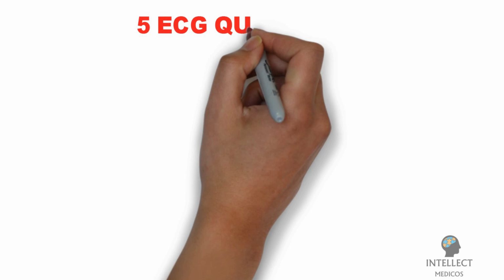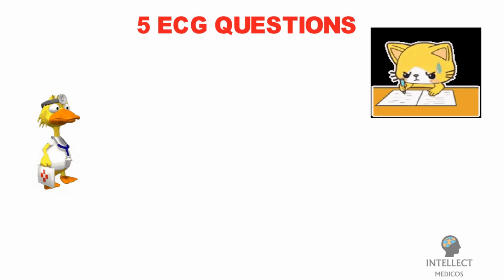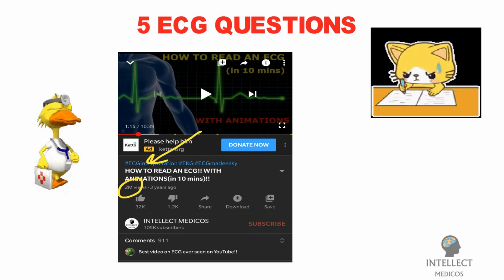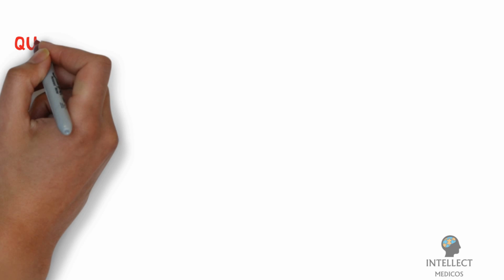So now let's start with 5 ECG questions which you commonly come across in your clinical practice or in your medical examinations. Before starting, I presume that you have gone through our first ECG video, which now has 2 million views, as that video will help you solve some of today's questions.